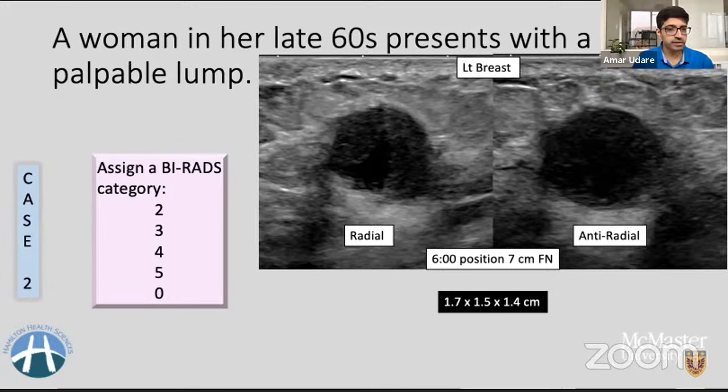So Amal, Minu, and Selda all have answered as BI-RADS 4. And that's exactly what we are looking for in this case. So what is our job? If we see this breast mass when the patient comes in with a palpable lump, always make sure that you at least add a mammogram if it is available at your facility.